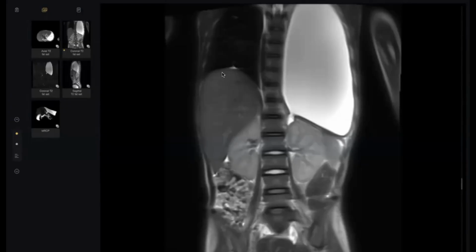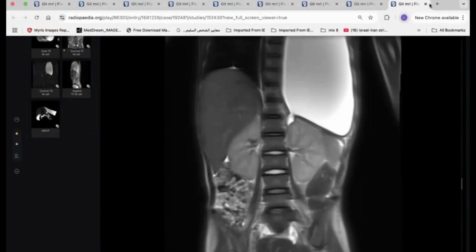Then I think if you give some contrast agent, it will communicate within the peripancreatic collection. What else? Sir, even we can aspirate. Excellent. And the analysis may show some pancreatic enzyme, pancreatic enzyme levels. Thank you, doctor, so much. Very fantastic case.